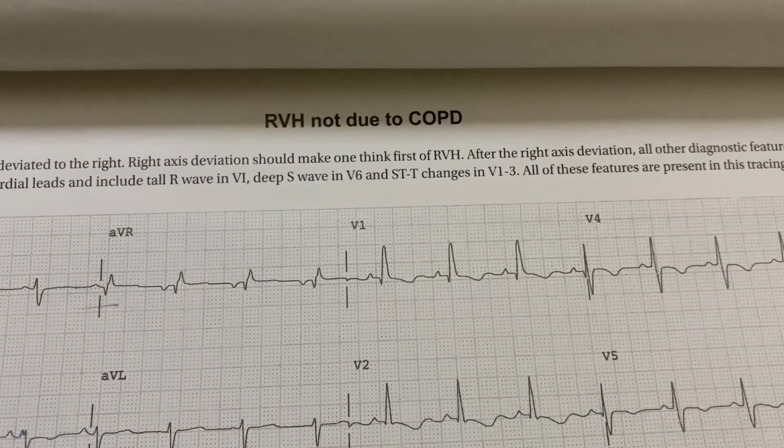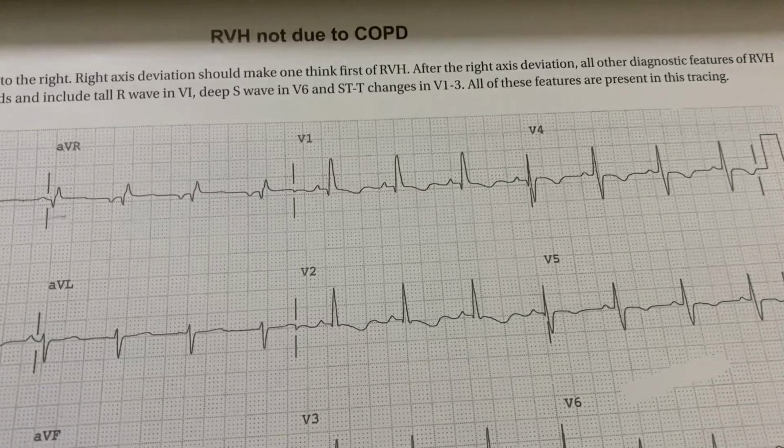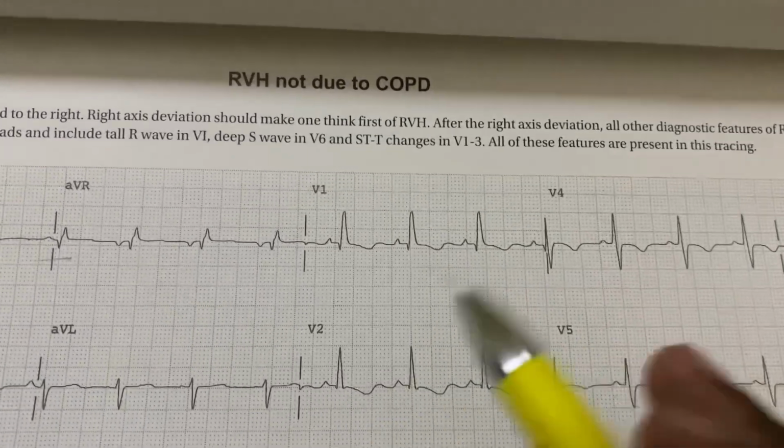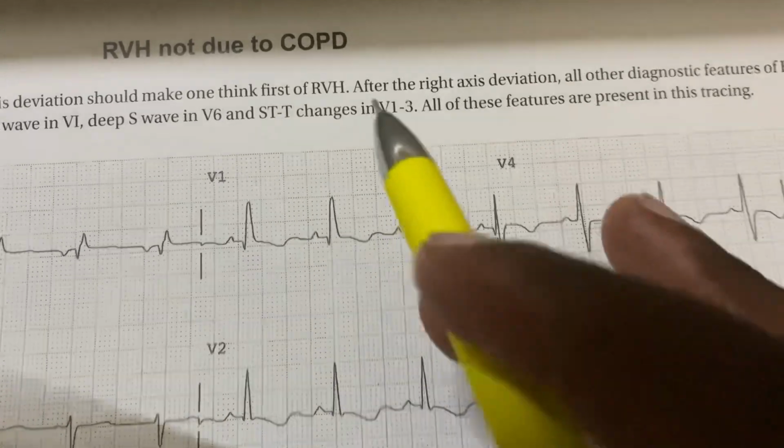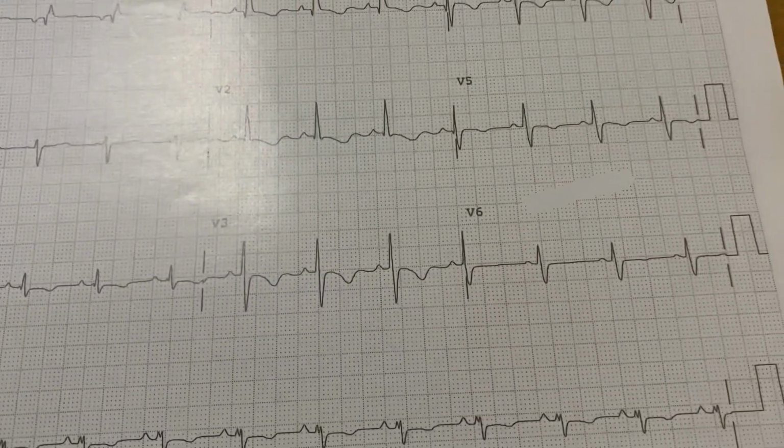If we check for left ventricular hypertrophy or right ventricular hypertrophy, we look for that in the chest leads.